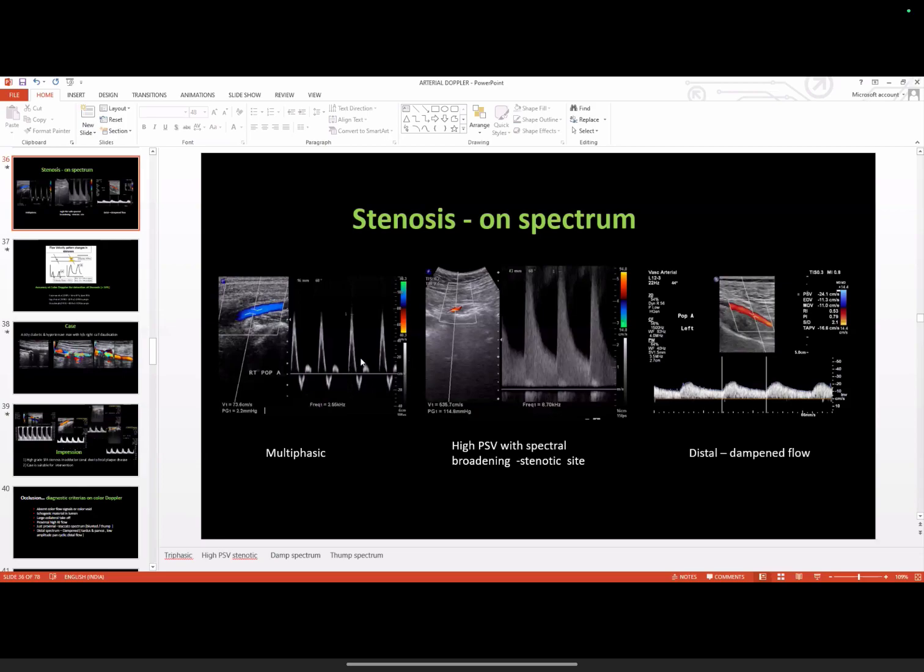There can be loss of early diastolic reversal. There can be continuous flow within the vessel. And again, the RBCs are running, and there is constant demand of blood throughout the cardiac cycle. The multiphasic spectrum becomes monophasic, the bandwidth will be increased and the spectral window will be less. So this can happen in pathological situations as well as in some physiological situations where there is continuous need of blood to the target organ or target tissue, right?